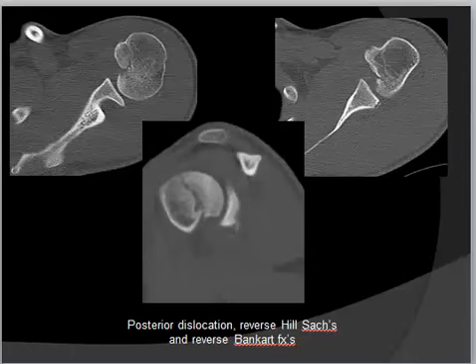Here it is, we have posterior dislocation, and in posterior dislocation, instead of having Hill-Sachs posterolateral, we have it medially anteriorly or anteromedial, and we have here the osseous reversed Bankart. This is the posterior part of the glenoid where there is a small fracture.